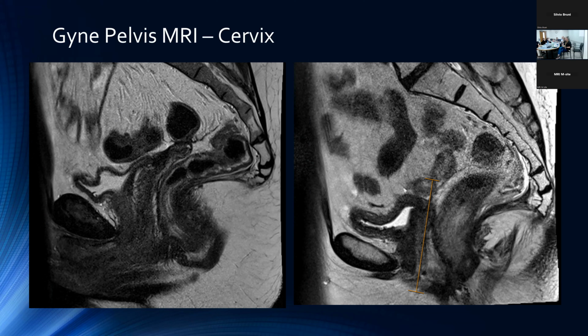They'll often be protocoled as a cervical case, but realistically, we're not as concerned with getting that proper short and long axis. That being said, if you so wish, you wouldn't be faulted in acquiring short and long axis images of the vagina.